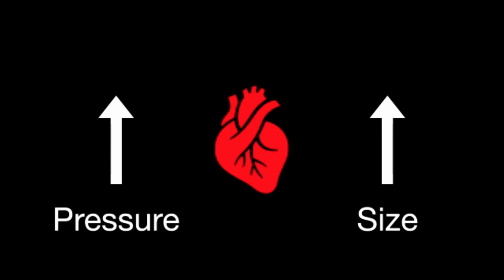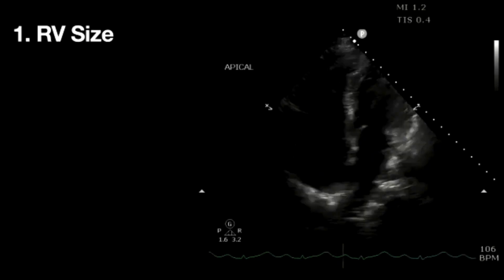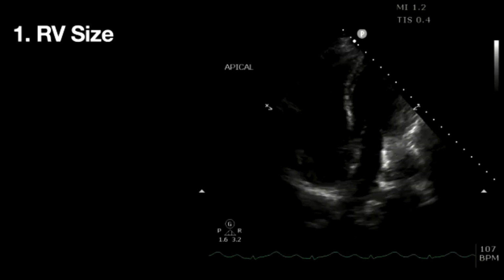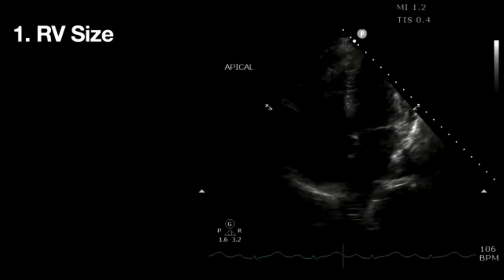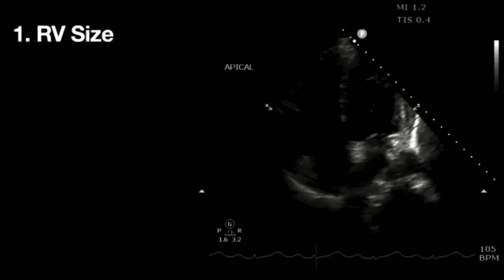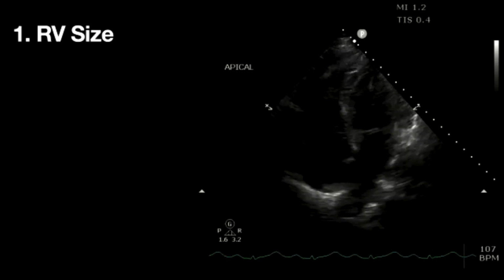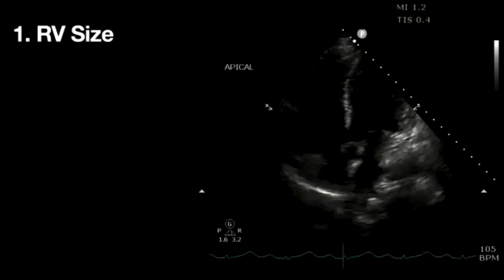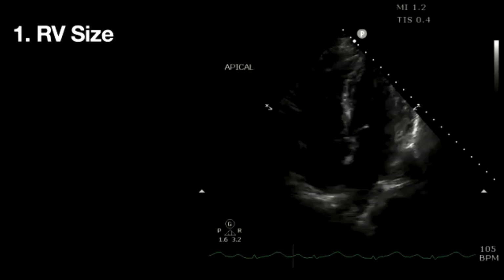So let's look a little bit at the ultrasound side of things. Let's look at some parameters, echocardiographically, of right heart strain that we're going to see in patients with PE. So the first big one, and I've got 3 of them here to show everybody. And Ashish, feel free to jump in if there's something you want to add as we talk through this section. This is to lay the foundation. This may be a review for a lot of people, but hopefully it will lay the foundation, with the 2D planimetry view of the echo, so that we can better understand the physiology when we start throwing Doppler on top of that.